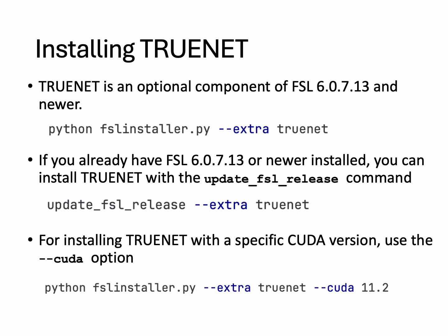So if you have already installed FSL and you just want to update the installation, you can of course do that too. You can do update FSL release, and again say extra TrUE-Net using the extra flag.